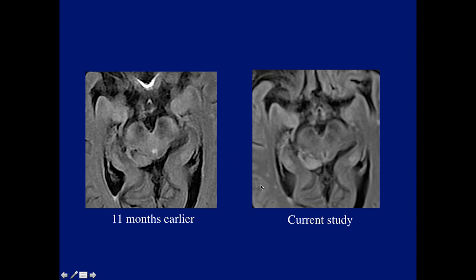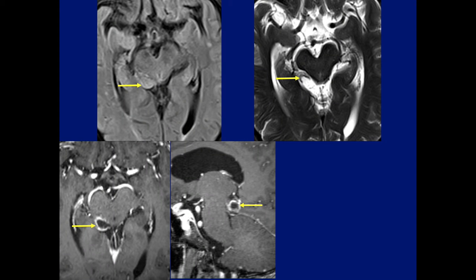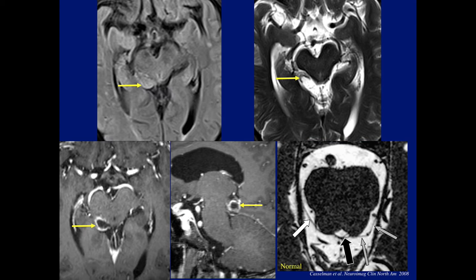So I think a highly malignant lesion or an infection was not likely, and it's likely that this was a schwannoma of the trochlear nerve, but the patient was lost to follow-up, so we have no more information. So again, likely a cystic schwannoma of the trochlear nerve on the right side. Again, showing where it would be. Here's the course of the normal nerve.